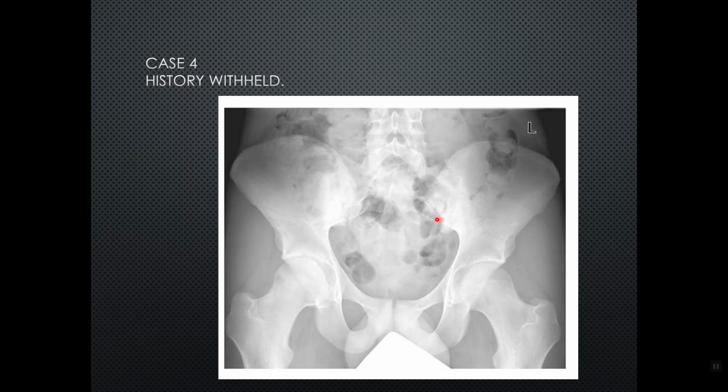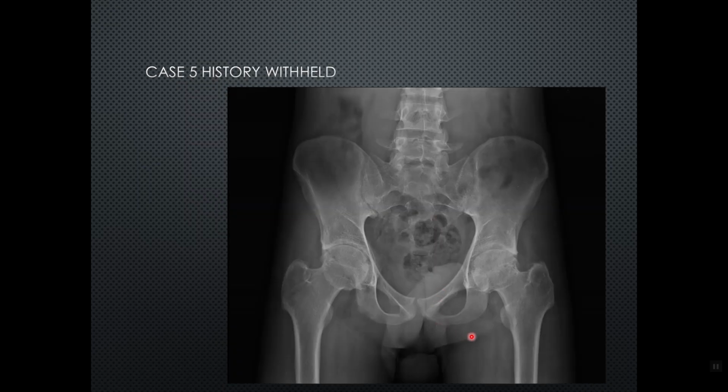In this case, you can see another case of ankylosing spondylitis. How do we know? Well, because apart from the sacroiliac joints, we also see some significant changes in the spine that I'm going to point out. As you can see, sacroiliitis, with indistinctness, erosion and blurring, is very characteristic of sacroiliac joint involvement. Another feature, you can see the hips are affected bilaterally, with uniform, concentric joint space loss. You can also see proliferation around the capsule of the hip, certainly suggestive of enthesitis.